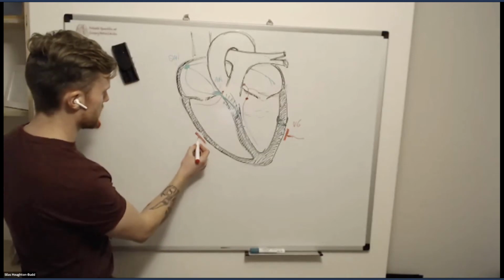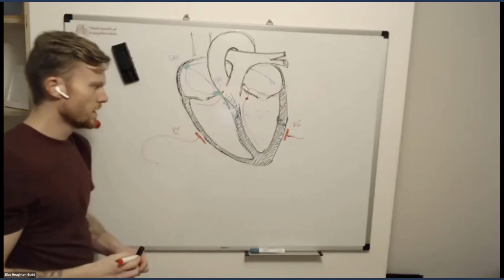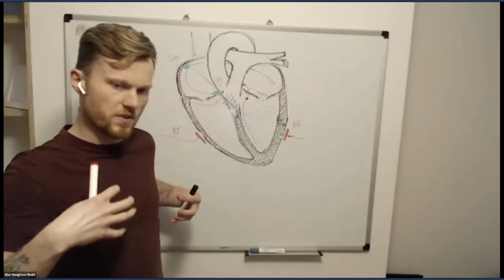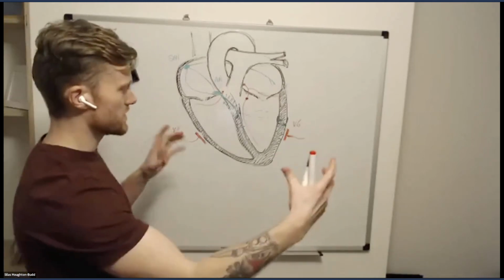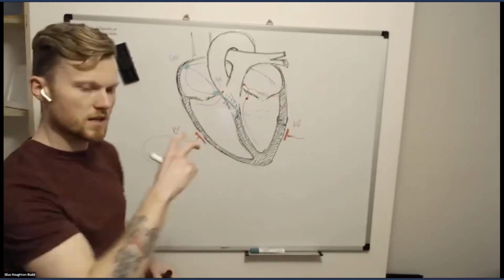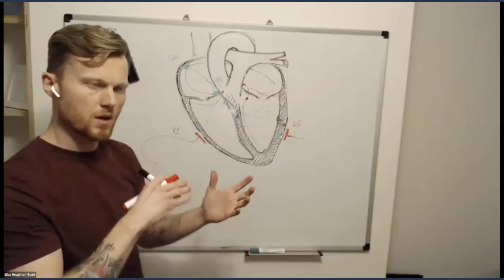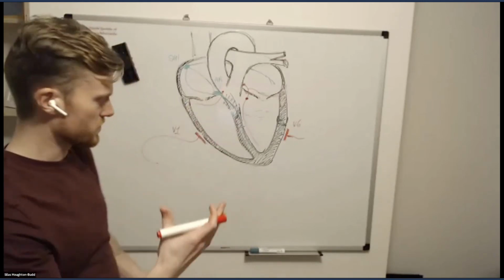That's essentially because, as they sit on the chest, they're opposite each other in terms of the two ventricles. They're the most opposite ones we can look at, and we can see certain patterns on each that can help us work out which branch is blocked, or whether it's just a fascicle.